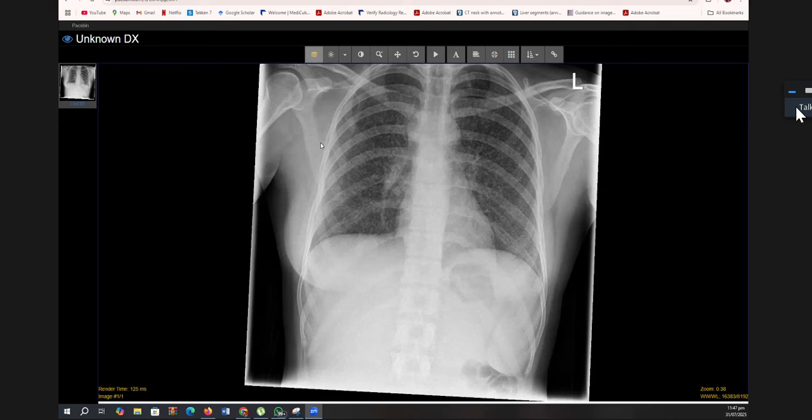So these are basically miliary nodules. Yeah. And sir, in differential, keeping in mind the history, my first differential would be miliary tuberculosis. Yeah. And if there is any history of a primary, then these could represent miliary metastasis. And if the patient is very sick, I could also think of fungal infection. But I'll collate my findings. Because the patient's so sick, what do you think the most likely diagnosis is?